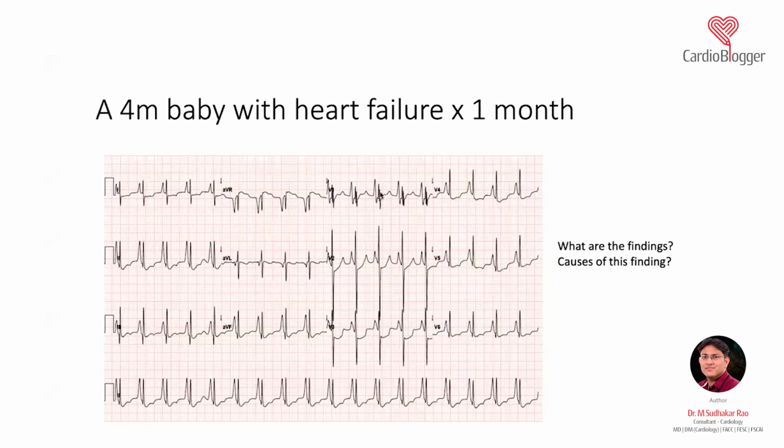But if you feel that this deflection is of a left atrium, then you can also argue with me that there are diseases in childhood like restrictive cardiomyopathy or dilated cardiomyopathy or multivalvular heart disease. Again, in a 4-month baby, multivalvular heart disease is out of the question. If this patient is an adult with biatrial enlargement, then biatrial enlargement can be in restrictive cardiomyopathy, dilated cardiomyopathy as I already told, or multivalvular heart diseases which can have both right atrial enlargement and left atrial enlargement. But these high P waves are usually suggestive of Ebstein's anomaly in an infant.